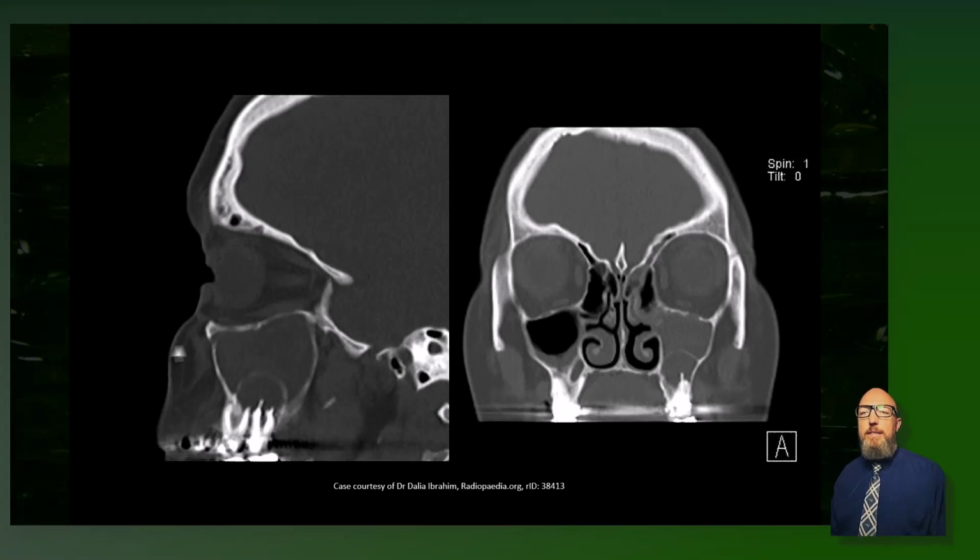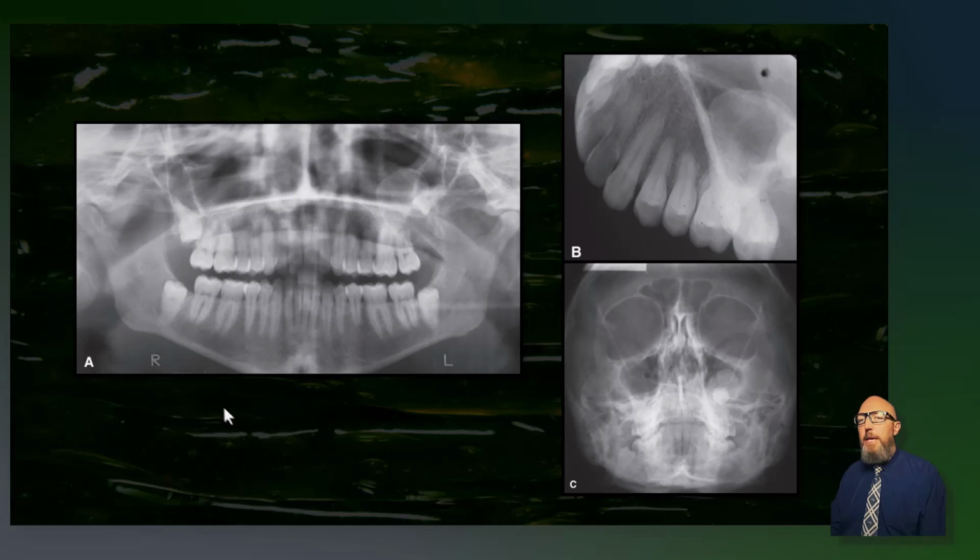And so your job as a dentist, whenever you see sinus opacification, always consider whether the source could be a tooth. So look really carefully at the teeth in that area, because that changes the entire management pathway. Is it just sinusitis? They need to see an ENT, they might need antibiotics, or is there a tooth problem? And here are some cases of dentigerous cyst associated with the sinus floor and displacing the sinus floor.